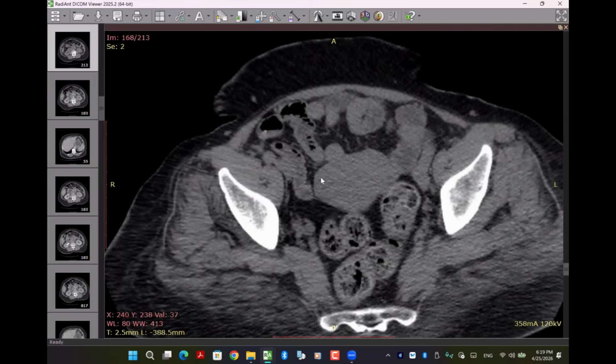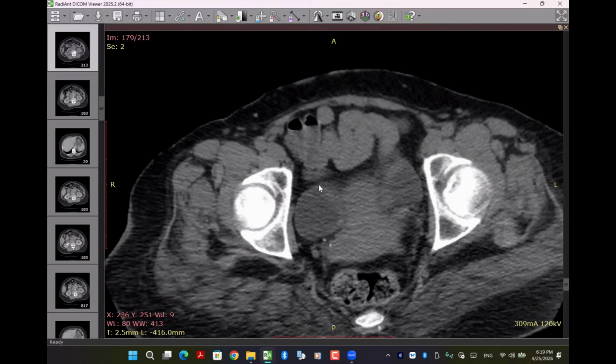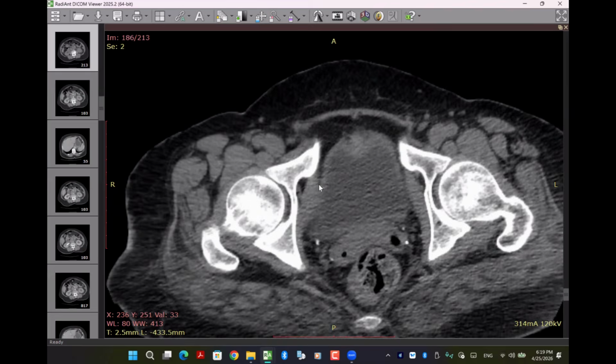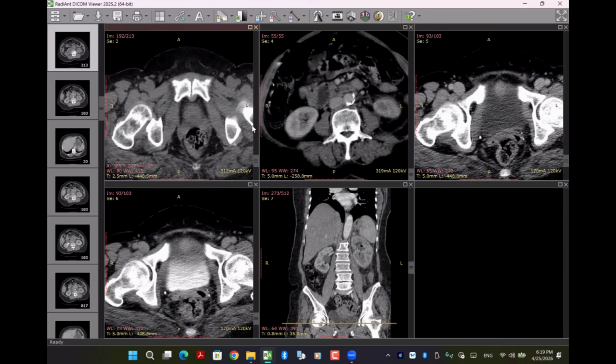I will look at the distal ureters as well as the urinary bladder for any other air foci or source of infection. Do we need contrast for this case? Yes, we need contrast because I want to see the lining of the ureter.